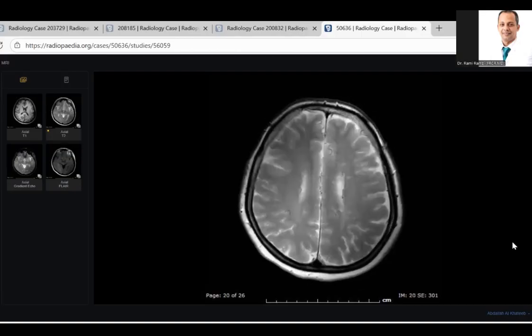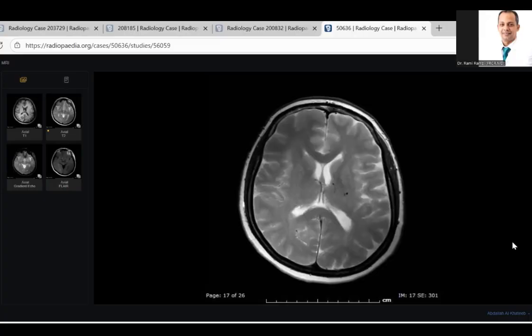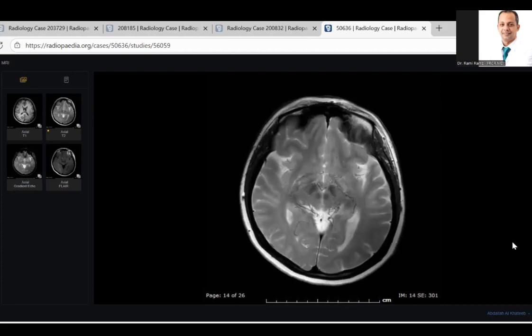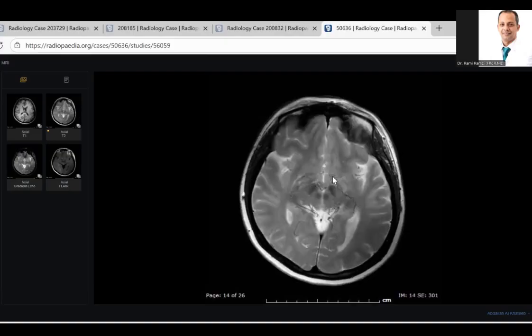So take care, my colleagues, to review areas of the brain. One of the most important is the vessels. Second point, when you find the pickup, the diagnosis, and the finding, try to concentrate and give as many buzzwords as possible. Doctor, this is multiple collaterals surrounding the narrowed terminal ICA and the markedly narrowed ACA and MCA. This is called puff of smoke. Like this, doctor, this is Moyamoya disease or Moyamoya syndrome.